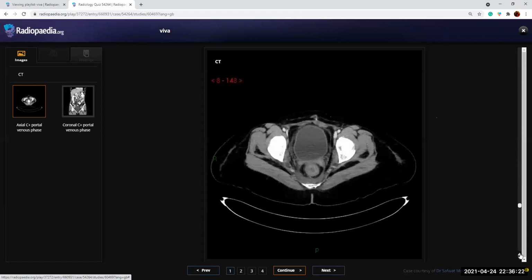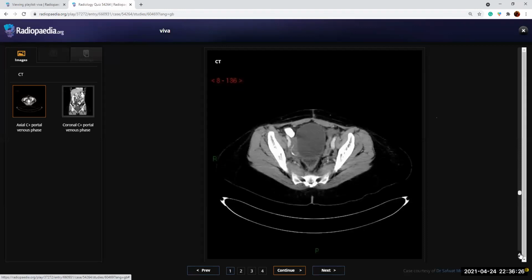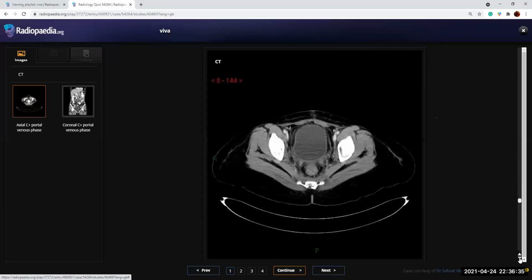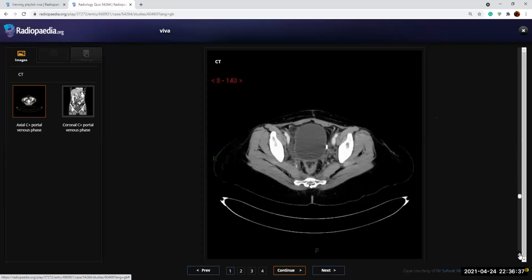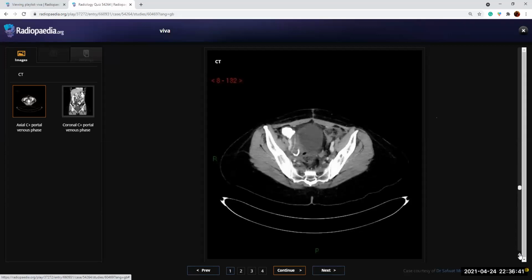So I don't see the uterus. And any evidence of any surgeries? Yes, there is a sign of a surgical clip on the left side. I said she had a previous treatment history, and now she has loose stools. You would like to put them together?